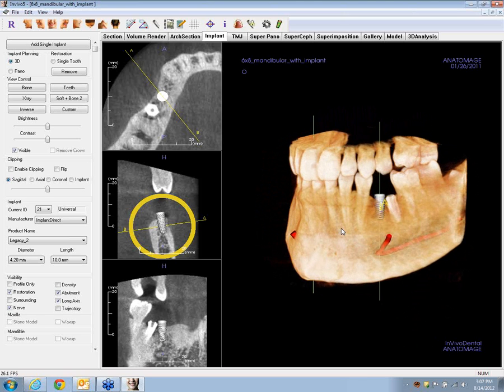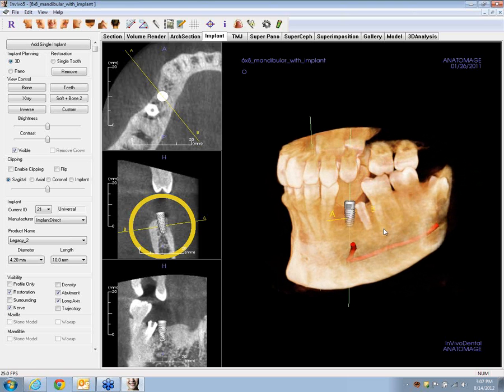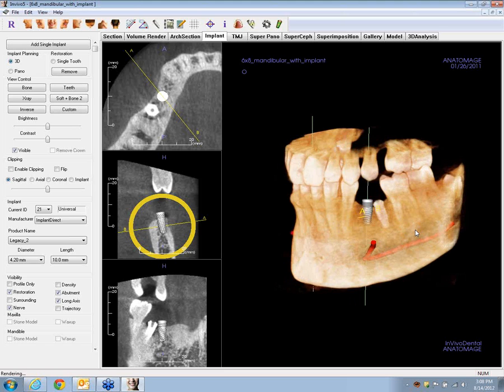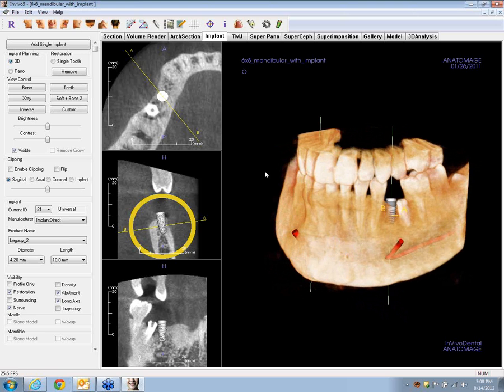And so you want to set up your library to encompass what you have on hand. You'll know if you need to change implants from what your defaults are, that you need to talk to your rep and get another different implant in place for the surgery for that particular patient. Now let's go ahead, and the implant customization happens with the little gear up here.